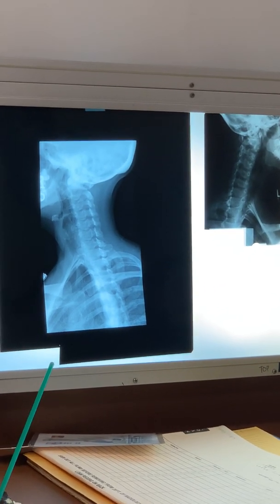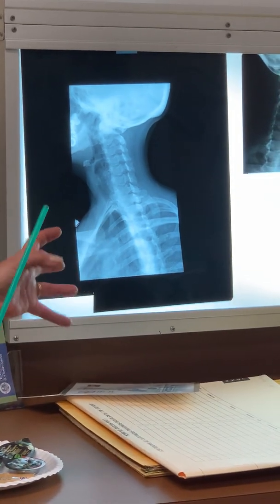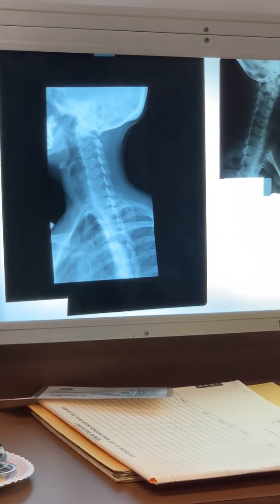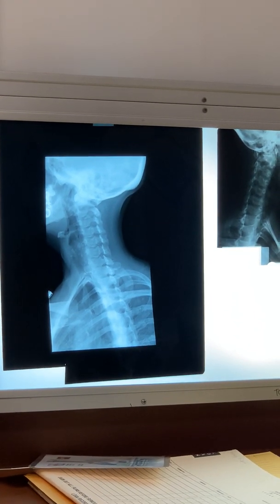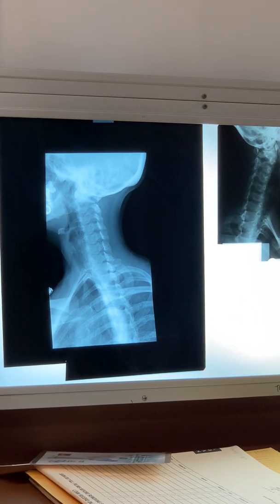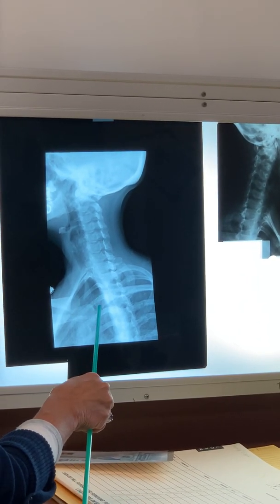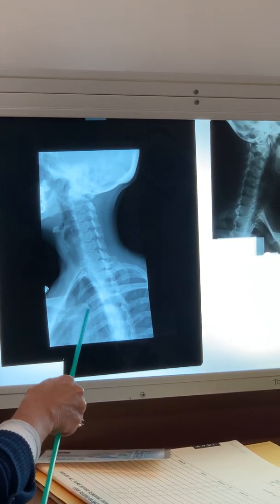No, it's just two ribs, the way that one's kind of spread out versus this one. Oblique is weird. It's hard to tell what's what. The ribs are kind of weird, aren't they? Because you can see one clavicle here, the other clavicle here. Kind of messes everything up. Sternum, you can see a little bit.